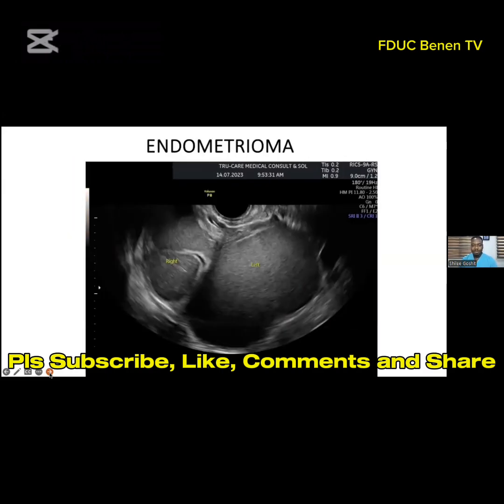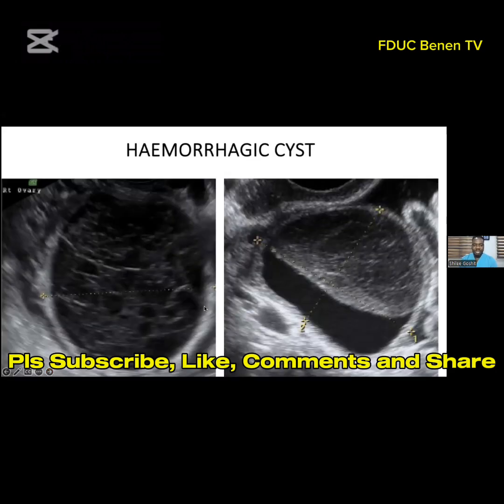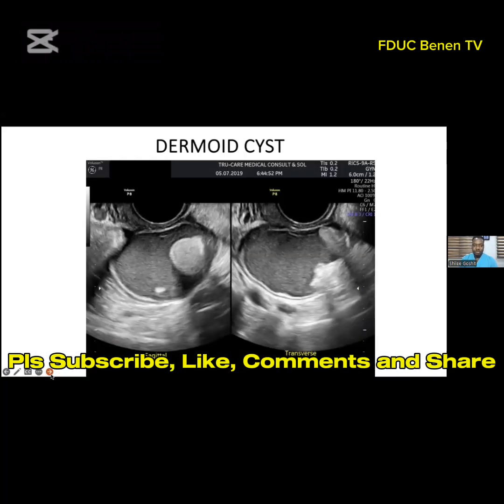We can see pathology like endometriomas. Again, based on pattern recognition, we have the IOTA nomenclature on this. Then we can have physiologic cysts, and cysts that are hemorrhagic, and depending on the phase of the clot activity, we may have different pictures of it.